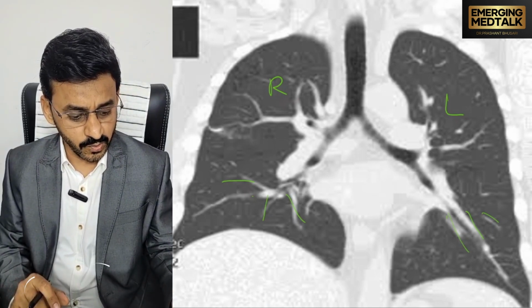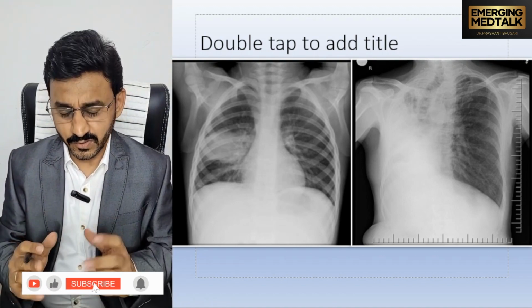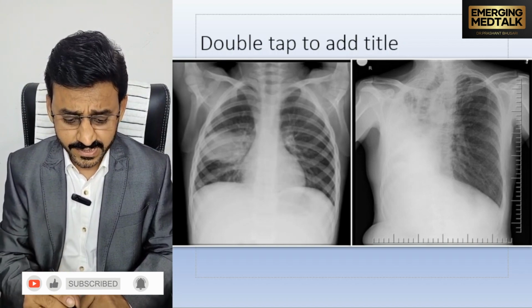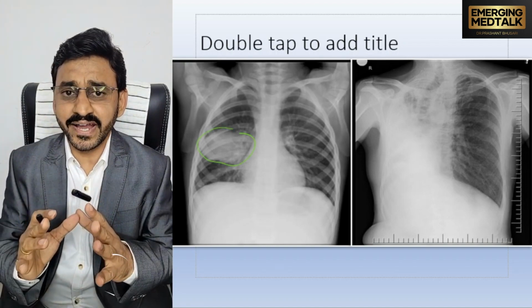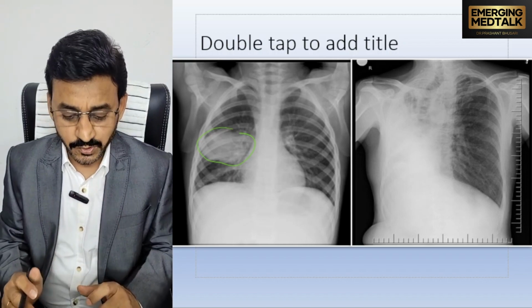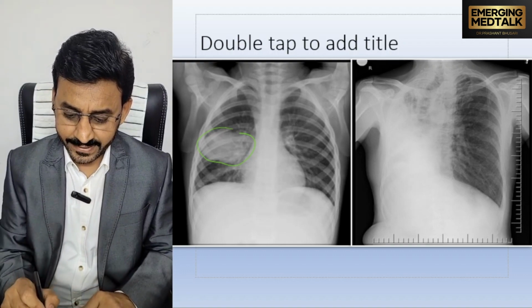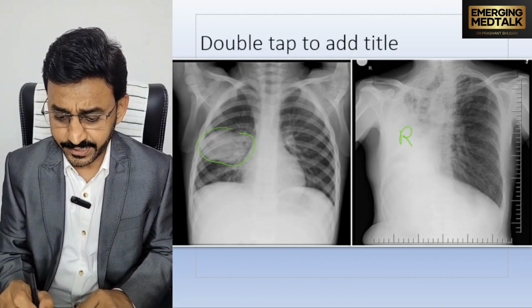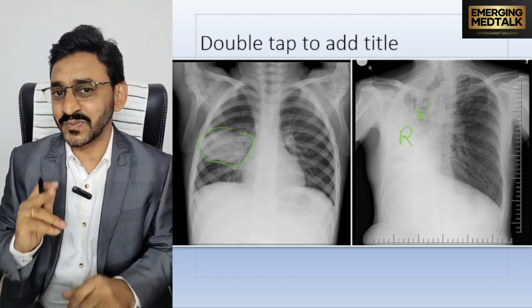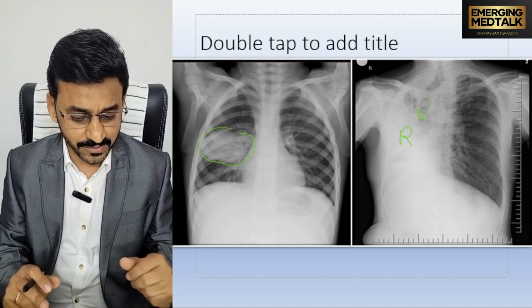We know this, but if there are any abnormal opacities, then we should know the conditions. Here we can see a radiopaque opacity defined in the right mid-lung zone. It may be due to consolidation, as in infective pneumonia. And here there is volume loss on the right side and shifting of the trachea and mediastinum towards the right side. This is the condition we call collapse of the lung.